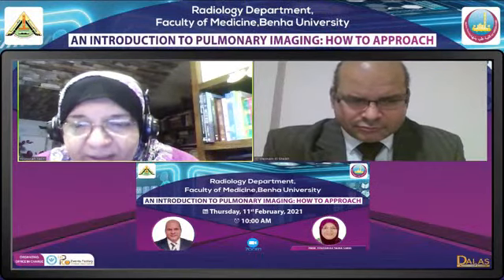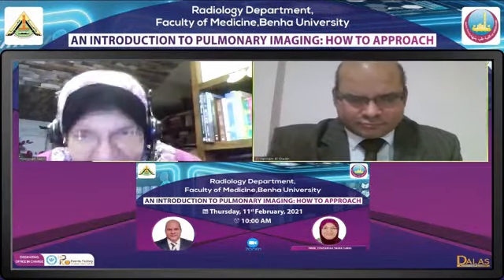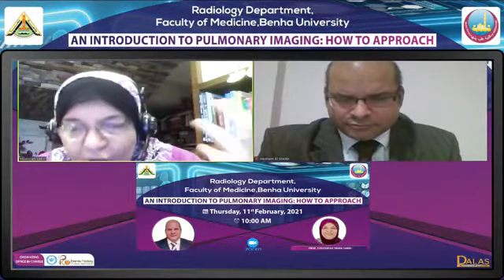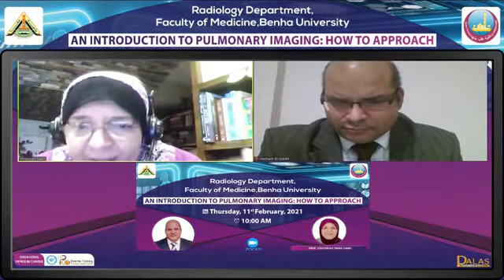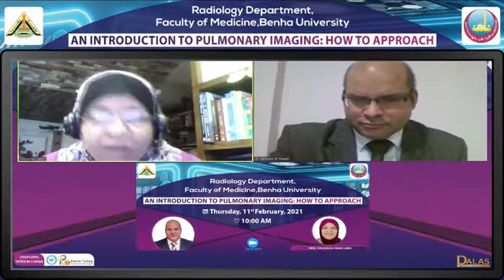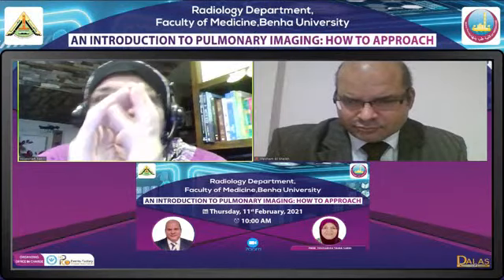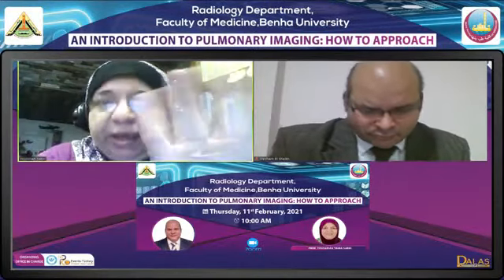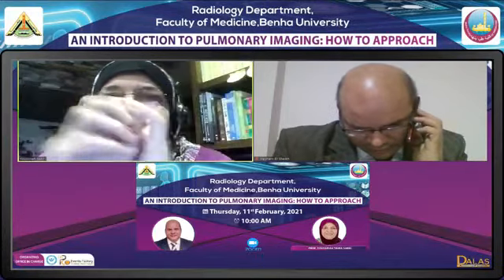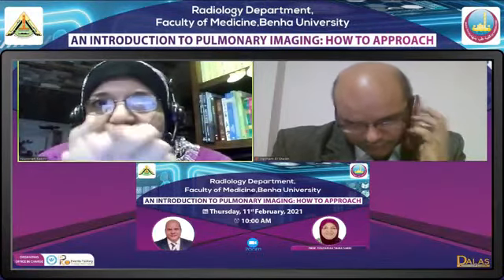فده قلنا المنظر ده ابيض في اسود والاسود دومينيتنج تمام. انا ما اقدرش اقول هنا ان في حاجه مخرمه، الاسود هنا مور اور ليس دومينيتنج، ما علينا يعني، لكن المنظر ده كونجنتال بالمونري مالفورميشن تمام. فانا ما ببصش على حاجه واحده، انا ببص على الحدوته كلها. اوكي، عندي لوب كله ابيض في اسود ومعاه فوليوم لوس، ده سيكاتريشال كولابس.